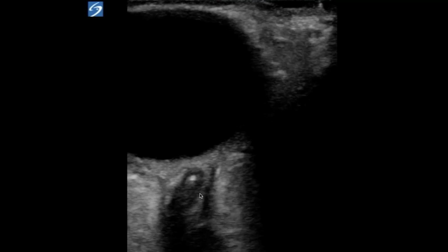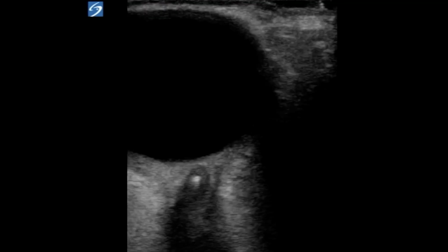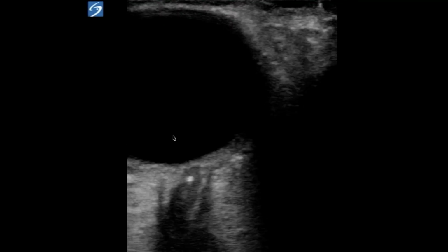There are several case reports out there of point-of-care ultrasound showing these little hyperechoic spots at the back of the eye in patients with fairly profound, although not complete, vision loss. Usually what you lose is all of your central vision and you have some light perception available because of some collateral vessels.